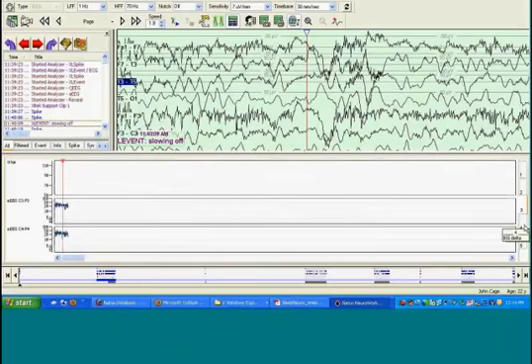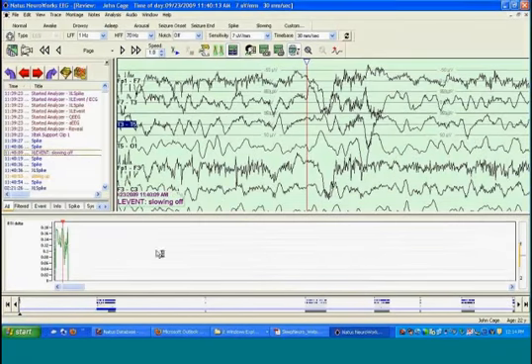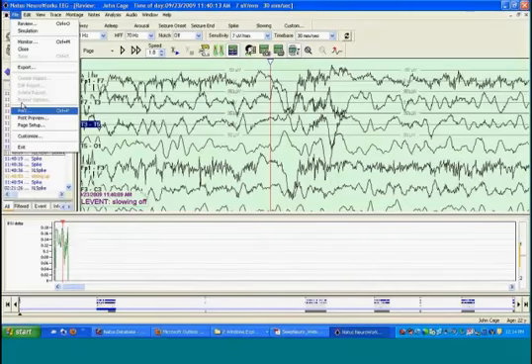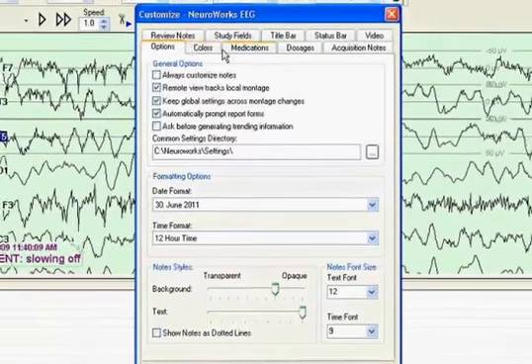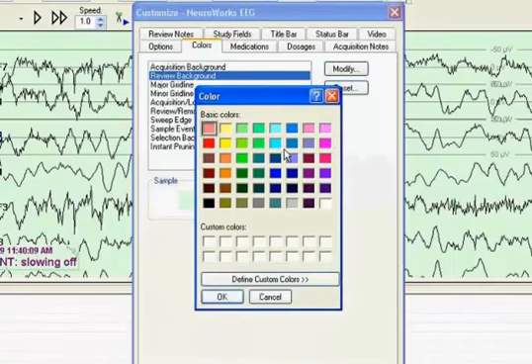So if you click on each of these tabs, it will save whichever trend you have added to those tabs. The arrangement of your window, the fact that we've got our Trend Summary Toolbar here at the bottom, the Study Toolbar here at the bottom, the fact that our Annotation Viewer is showing at a set size. You can also move your toolbars around if you like. All of these settings, including your background colors as well. So if I wanted to change my background color, I went to File, Customize Color, and changed it to a lighter blue, let's say.